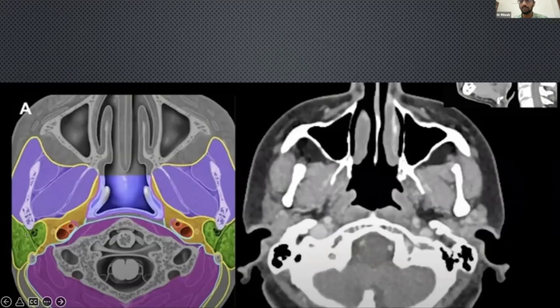If it is a parotid space lesion, it will be pushed medially. If it is the perivertebral or the carotid space, it will push it anteriorly. In such a way it helps us find the origin of the tumor.